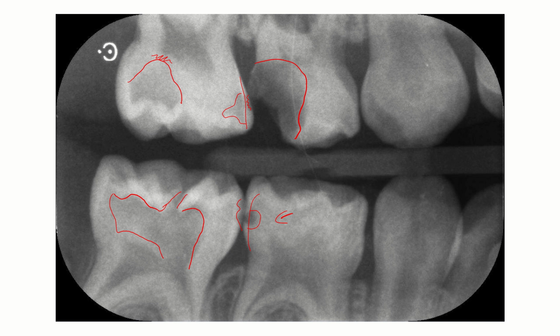And when you went into that cavity, you would find that all that was there was a shell of enamel, and the dentine is almost entirely carious inside. This is a huge carious lesion, and this is definitely into pulp, so it would be an RC6. There is no definition between pulp and radiolucency there. So in total, we've got 1, 2, 3, 4, 5, 6 lesions, 6 radiolucencies on this radiograph.